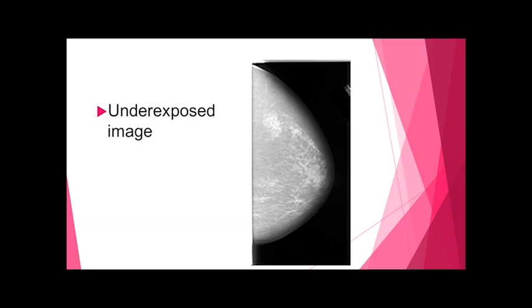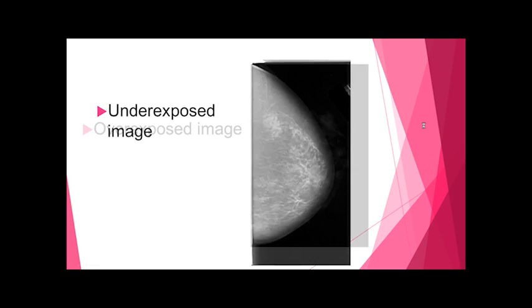That's why we have these post-processing algorithms in digital equipment. So you can see here this image is clearly underexposed. It's very gray. This isn't penetrated well here. So they'll mark you off for exposure on that.